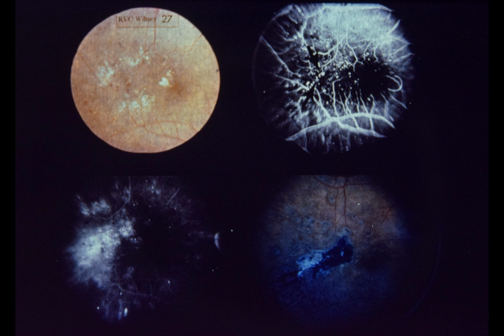Argon laser photocoagulation burns were applied in nearly confluent fashion inside lipid ring and to all microaneurysms and telangiectatic vessels outside lipid ring, causing macular edema. 1 year after treatment, lower right, note pigmented photocoagulation scars and complete reabsorption of lipid. Visual acuity improved to 20/20.